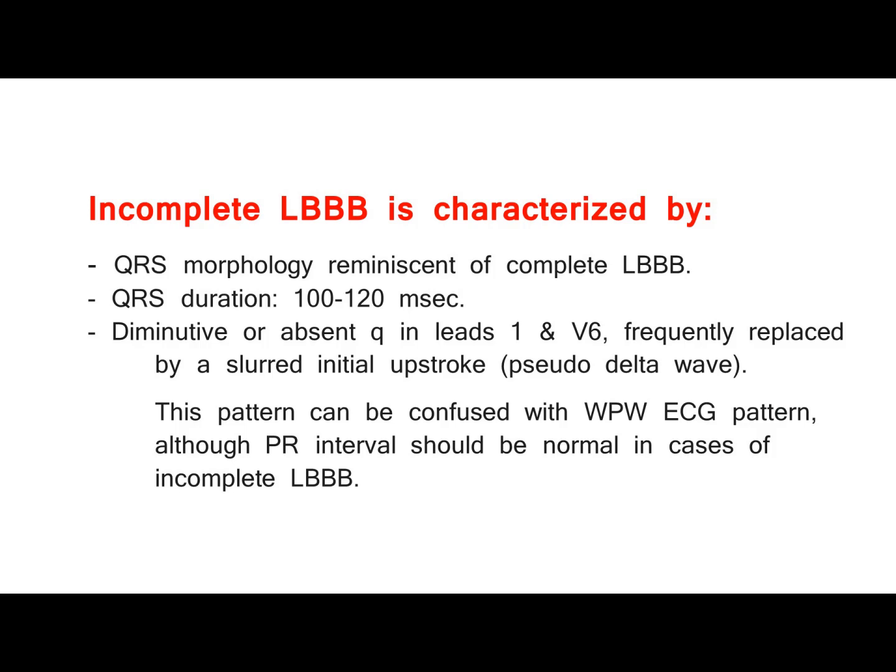Diminutive or absent Q in leads 1 and V6, frequently replaced by a slurred initial upstroke, pseudo-delta wave. This pattern can be confused with WPW ECG pattern, although PR interval should be normal in cases of incomplete LBBB.